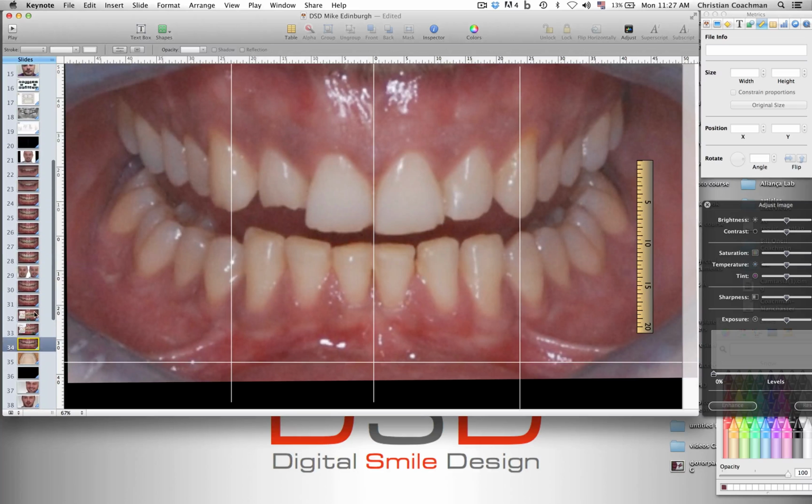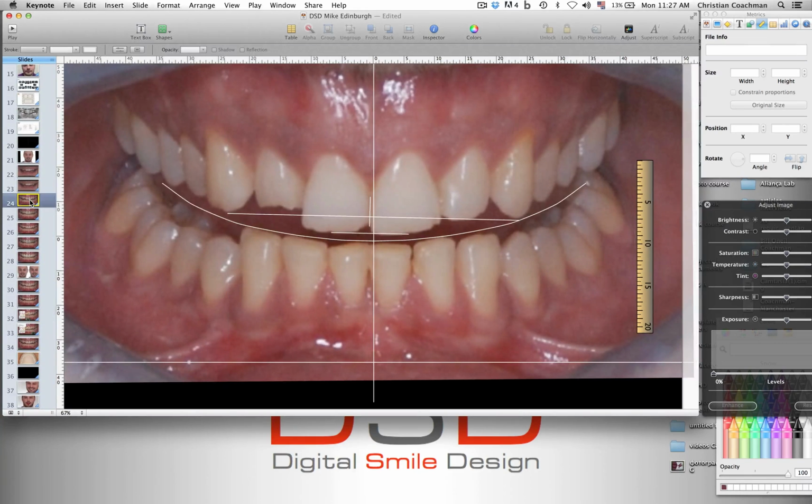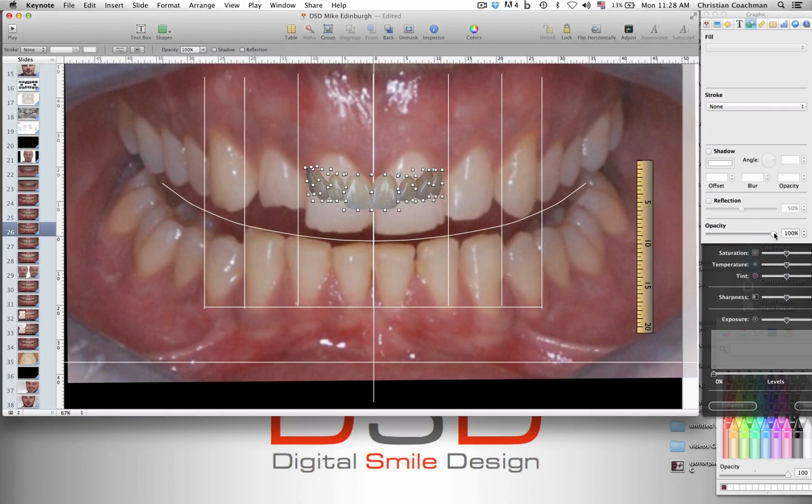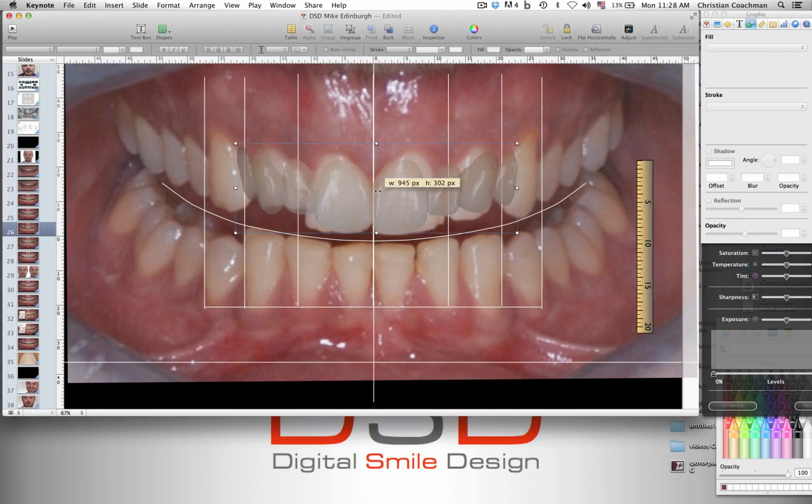Where is it? Then I can paste them over here. I can put some transparency to see what I'm doing. And I can group them to be able to enlarge them together. See how we enlarged. With the fingers here, we can enlarge on the pad.